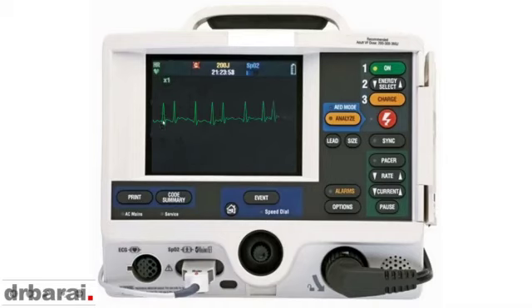First of all, the QRS complexes are irregular. It's all over the place. Sometimes very fast, maybe around 200 beats per minute, sometimes a little slow, maybe 100 beats per minute. There is no obvious P wave that we can see. The baseline is quite irregular, and this is atrial fibrillation.